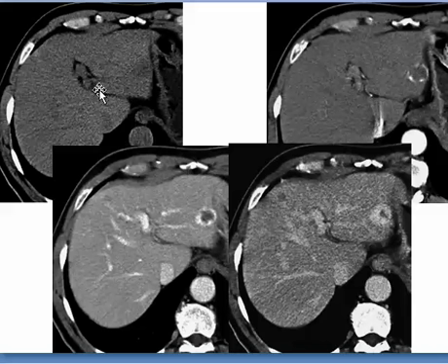Now here in this image you hardly see this lesion, but once you start to inject, we can say that it's appearing hypodense. When we start to inject, we have the nodular outline which is increasing with time, and in delayed images it is almost trying to fill the whole space, and this is called the closing iris sign, and this appearance is characteristic for hemangioma.